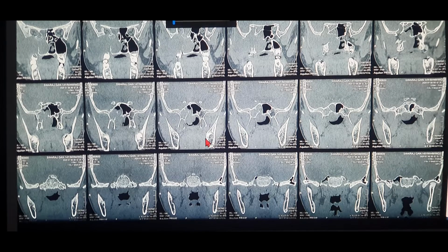It will never enter through the natural ostia. Remember that, guys. So from the foramen, it enters medially into the nasal cavity. From the nasal cavity, it goes posteriorly into the nasal choana. From the choana, it goes above by destroying the roof of the choana, or you can say the floor of sphenoid. So into the sphenoid. Okay, so that's how it goes. If anteriorly it enters, it extends up to the nasal tip. That's the nares. So that is the anterior extension.